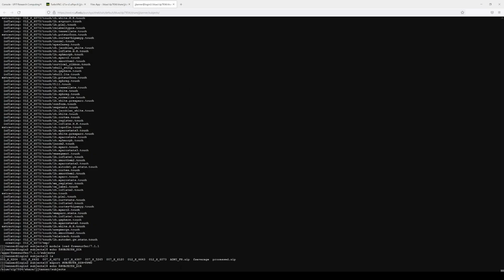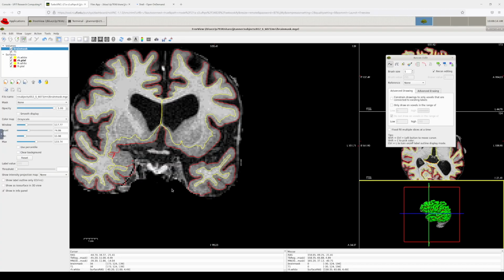Oh, I lost connection. Let me try this again. So let me show you one way to make a backup of the file first. And that is just in case you make an error in the processing, you save it, or your cleanup and you save it, and you kind of realize, oh, I shouldn't have done that. Then what you can do, you can undo. There are ways to undo what you're doing. But, so let me show you this.